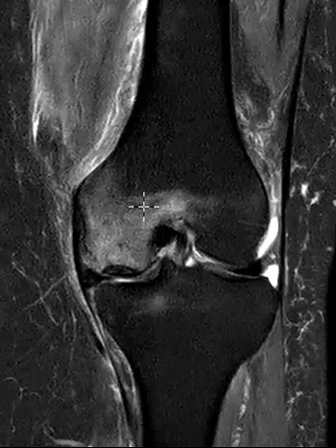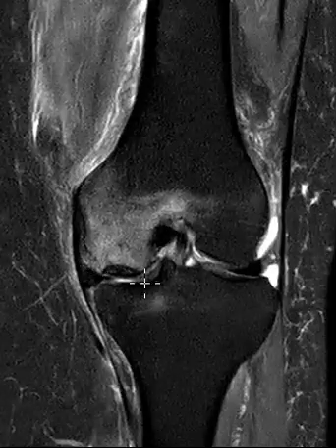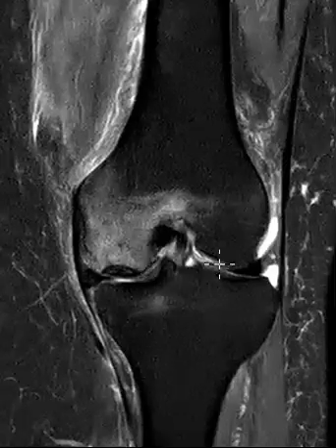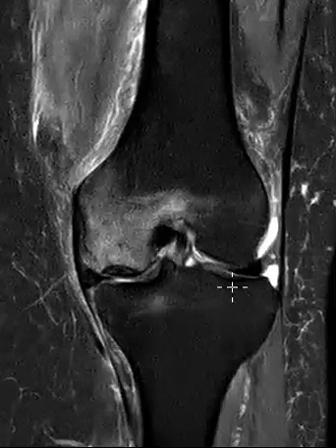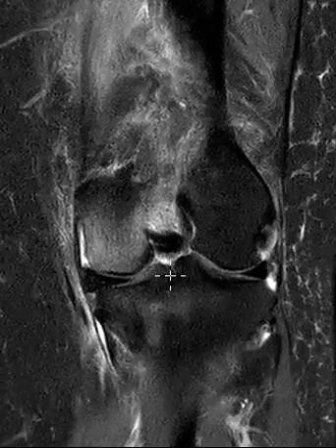And you can also get this pattern with spontaneous osteonecrosis. If you have AVN of the hip, you can get a very similar pattern with lots of marrow edema. You can start to get a collapse of the articular surface like this. But so when we see this view, we're like, yeah, one of these two things probably. So we go backwards, we look for this medial meniscus root and posterior horn.